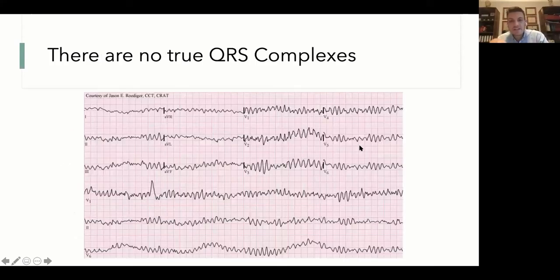And you can see here that it is exactly the same as atrial fibrillation. There is no proper formation of waves that correspond to the ventricular depolarization. Does this make sense? It fires at random at a very fast rate that the computer cannot cope with writing on the paper at the correct rate. So now you will say this completely looks like polymorphic ventricular tachycardia. And this is true. It does look like polymorphic ventricular tachycardia.